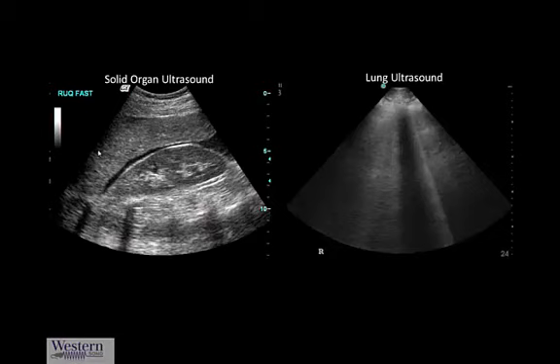The biggest rub with lung ultrasound for most people is the fact that it's non-anatomic. When you look at the rest of point of care ultrasound, you look at the anatomic images like this FAST exam with fluid around the kidney, the liver. You can show that to patients' families, to the janitors, to the nurses, to the hospital CEO, and everyone understands intuitively what they're looking at or can get behind it a little bit.